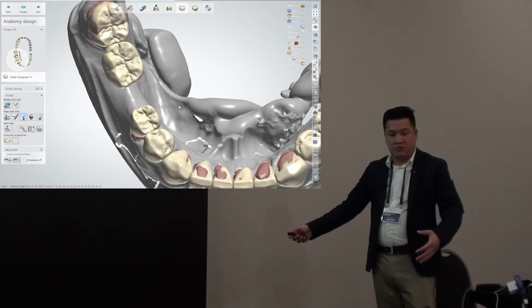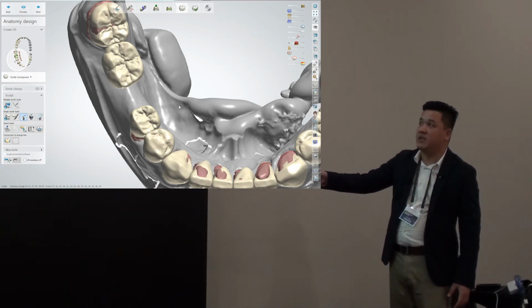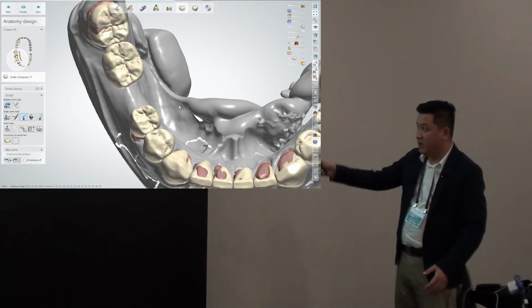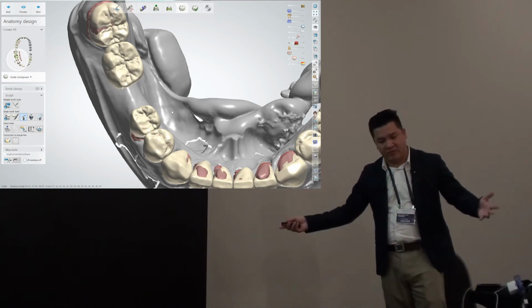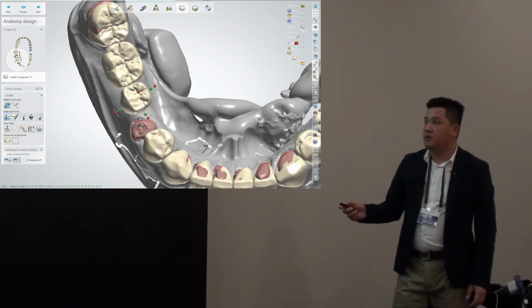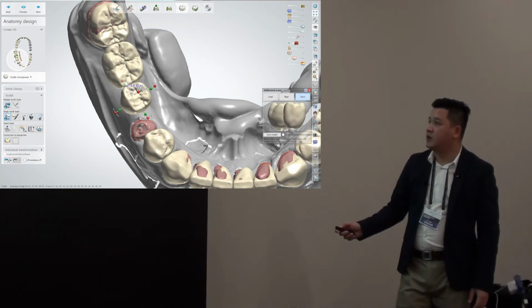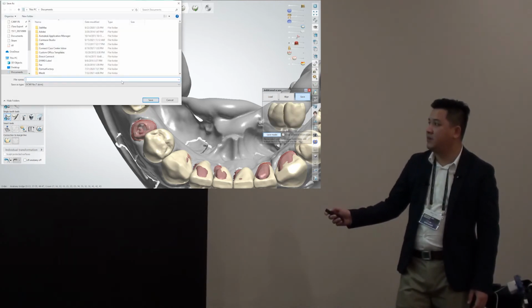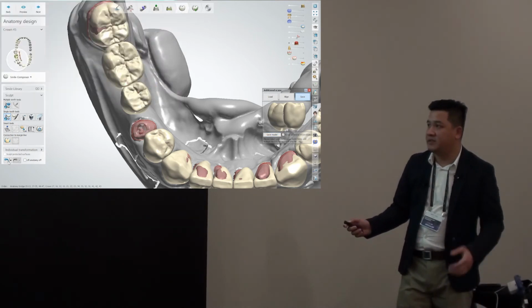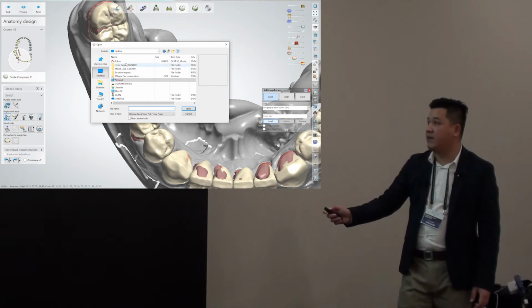So what do? Do you close the order, reset number 4.6 and 4.7 and make that 4.7, 4.8, add another one in here and introduce some chaos in our lives and we lose 2 hours of design? Of course not. What we do is we just grab this tooth here, move it over, bring up the additional scans tool, go here, control click, select both, keep additional information, save this. I have a temporary folder, I name it 1.dcm. Bring this back and control Z, load that file back in.